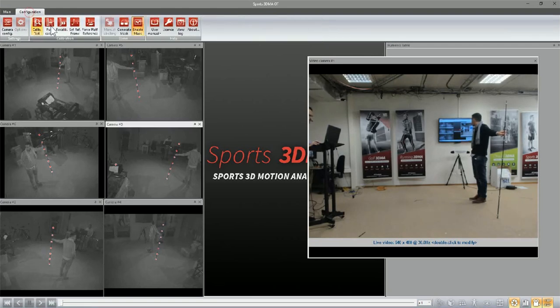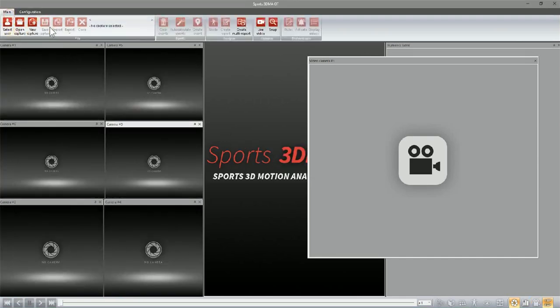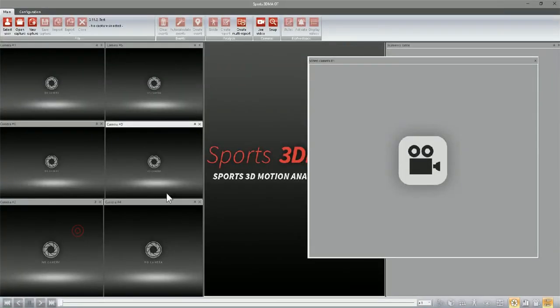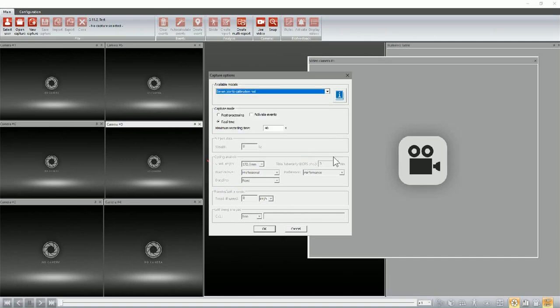Let us quickly perform a calibration test. It's just good calibration, obviously, because I just calibrated the system. And just for the sake of curiosity, I'll run a test with rod calibration tracking, 7 points calibration rod, real time.